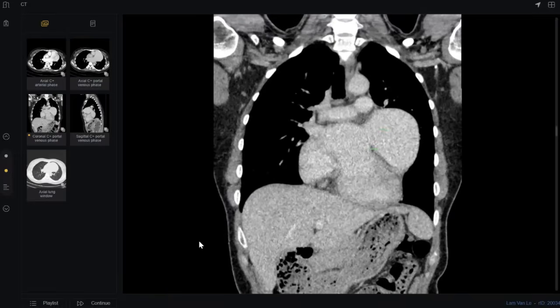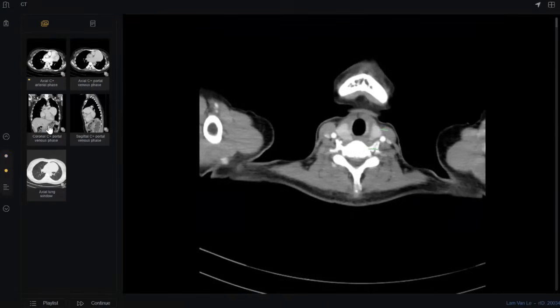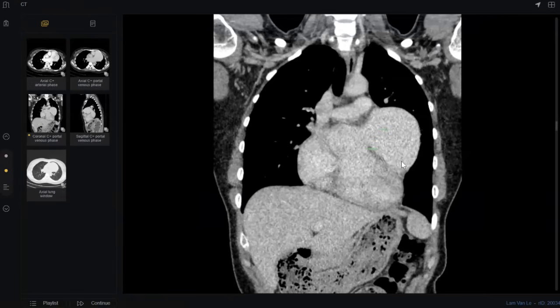She saw a mediastinal mass and gave all possible differential diagnoses here. Then it was surprising, because it's totally enhanced. It looks like a cavity containing contrast, not just uptake of contrast. And there is a connection, best seen in the coronal view, with the left atrium. So this is aneurysmal dilatation of the left atrial appendage.